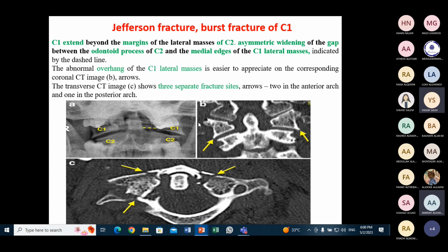Jefferson fracture is a fracture that can be seen in the C1. It can be on one side or two or three. For the signs on the odontoid process open mouth view, the normal X-ray does not give us assessment of this condition; we must do the odontoid process view with open mouth.